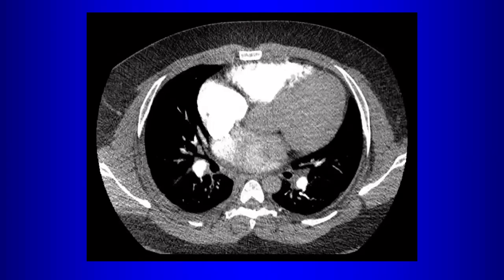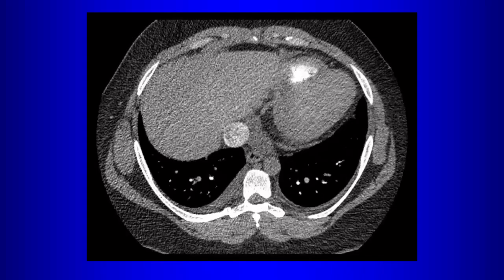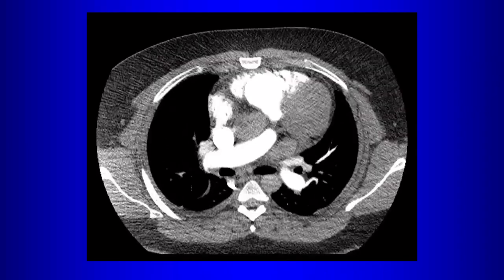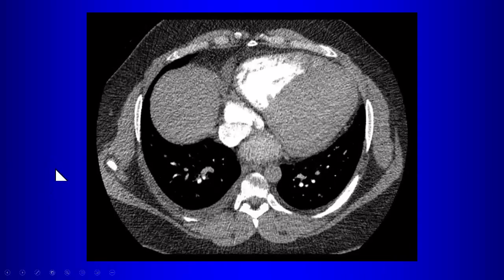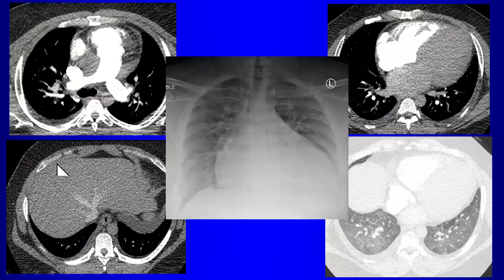Right? And there's another finding here that also goes with failure. Yeah, there are pleural effusions. Okay, so this patient's symptoms were due to failure, not pulmonary embolism. Now, we did tell them that on the chest radiograph, right? We read this chest radiograph from the ER: yes, cardiomegaly, vascular congestion, it looks like failure, but they did the PE scan anyway. It's not unusual here.